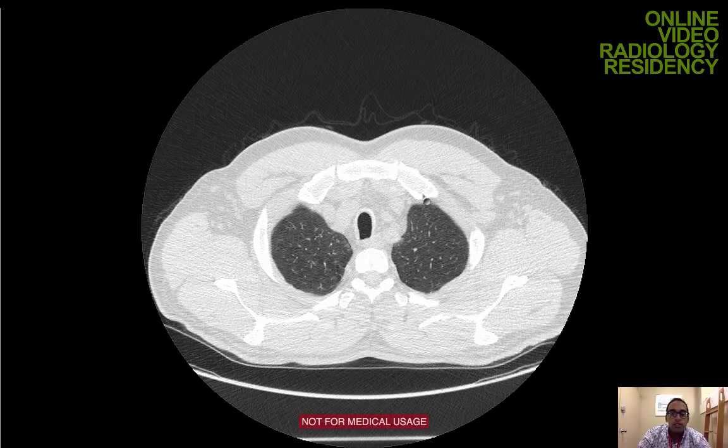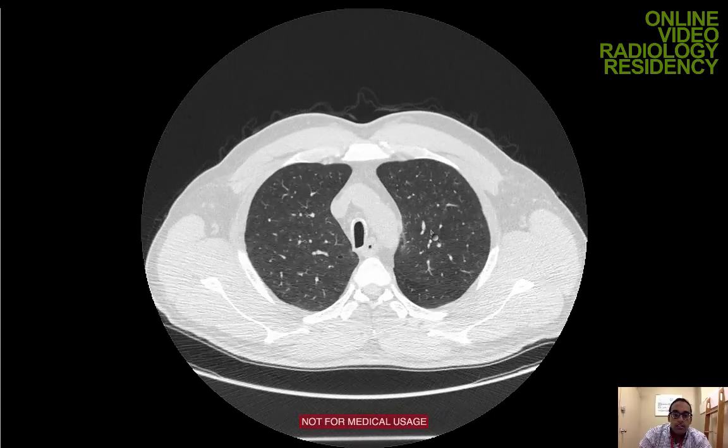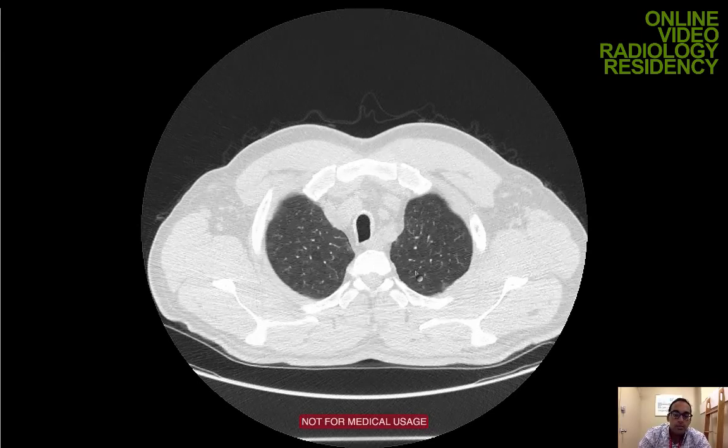Okay, so welcome to the section on non-contrast chest CT. I'm basically going to show you a basic search pattern for looking at a non-contrast chest CT. And first, you just want to start with the technique. So what is the technique of the study I'm looking at?